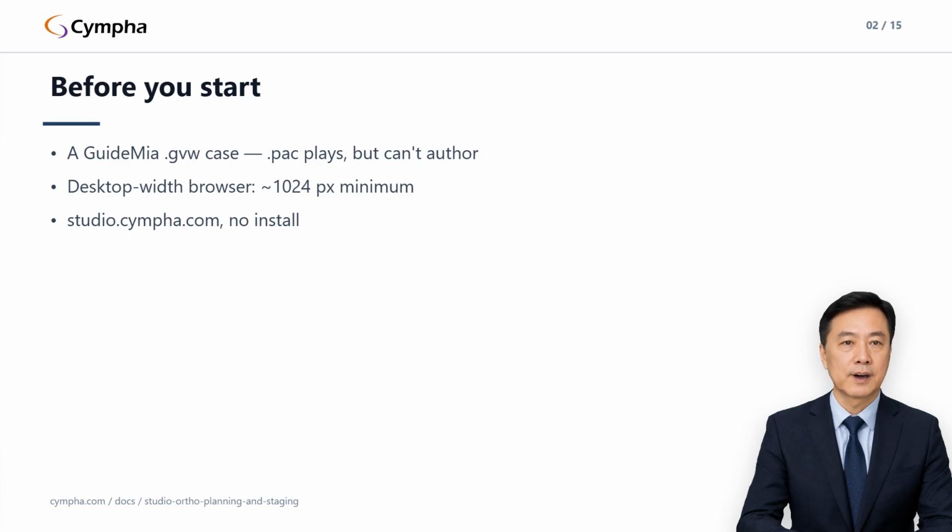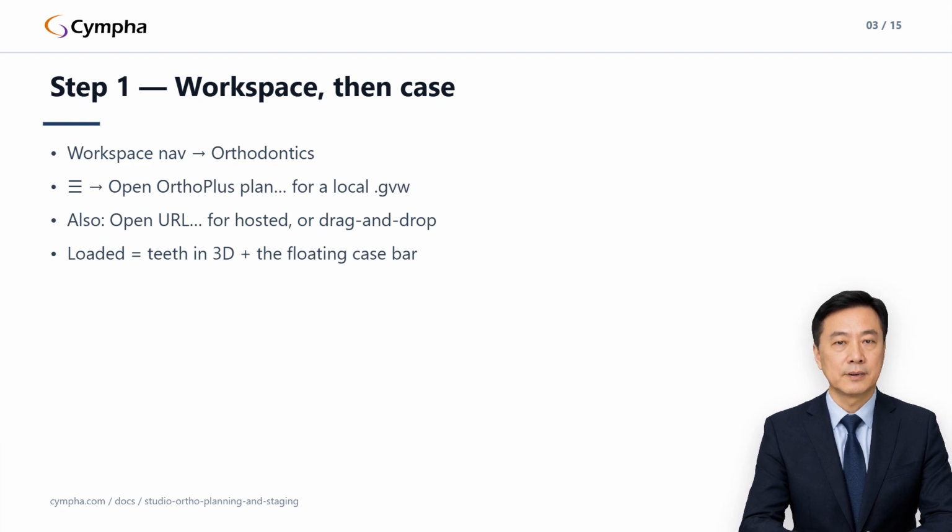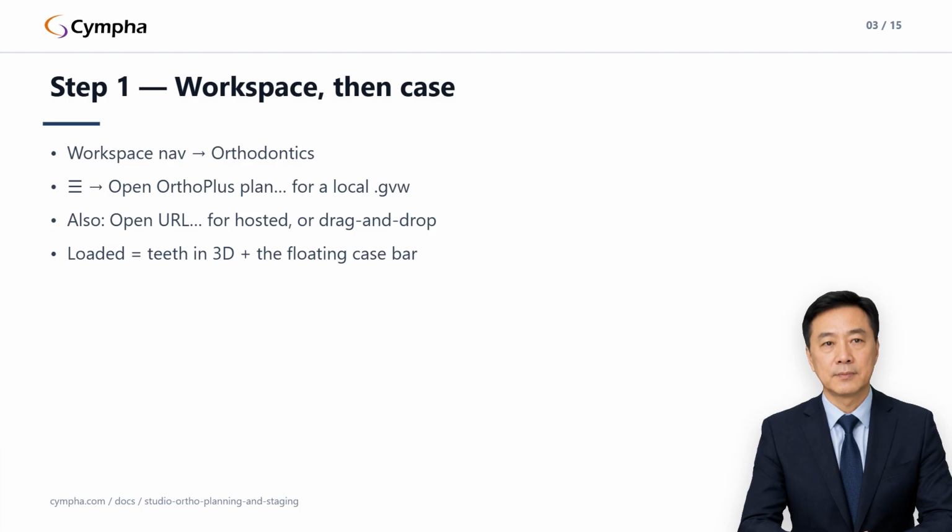Open optical scan file also accepts the case formats. Open URL takes a hosted link, subject to the usual cross-origin rules. Or just drag the file onto the viewer. And a convenience, a case deep link in the URL switches you to the orthodontics workspace automatically. However you load it, wait until the progress indicator clears and the teeth appear in 3 dimensions.